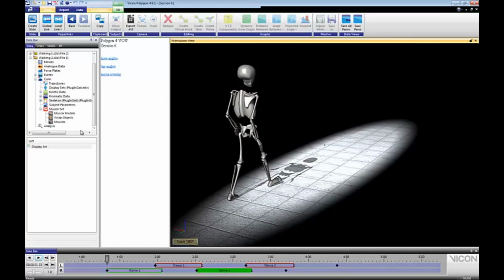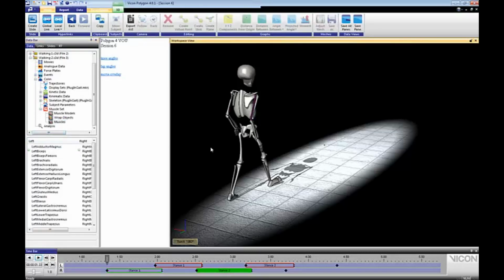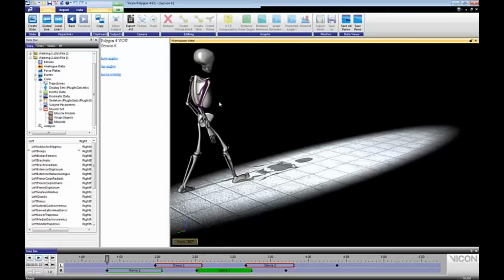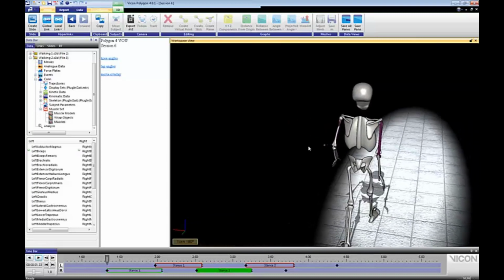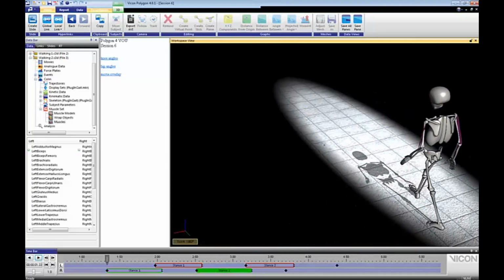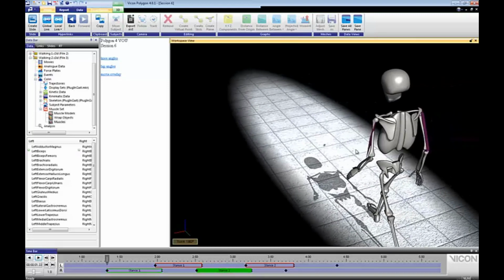And then if I want to display one of the muscles, I can just click on it and then select any of them. Say I'll do the bicep set. So then you can see how those populate. Oops, sorry guys. I'm apparently click happy today.